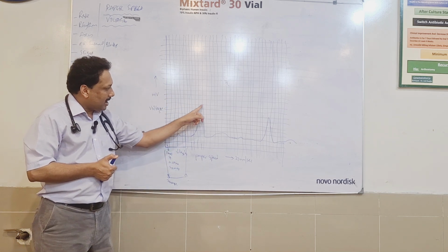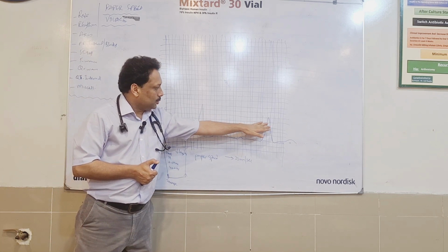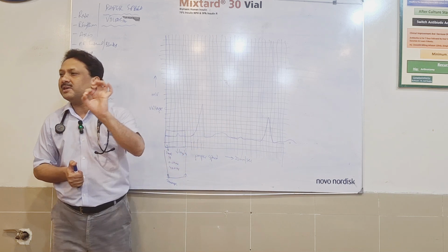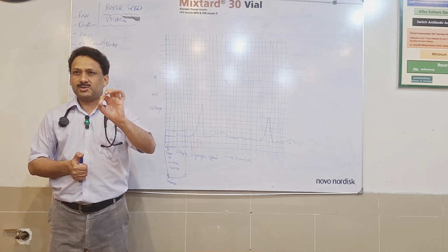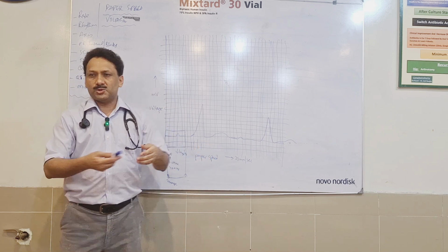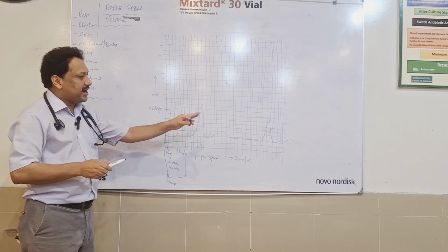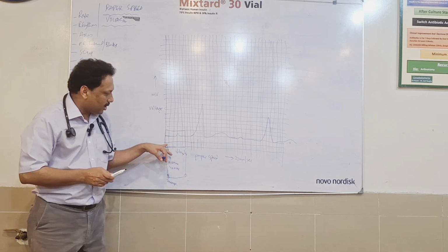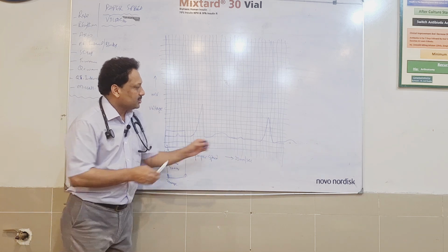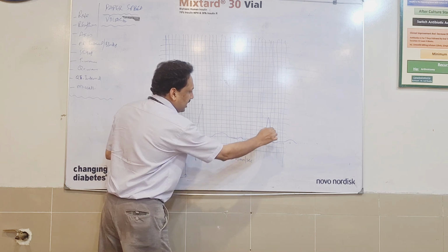I mean the difference between two RR intervals should be 0.8 seconds, because the cardiac cycle is 0.8 seconds. So if a person has an exactly normal heart rate, after every 0.8 seconds, and if I am talking about 0.8 seconds, how many boxes should there be? 1 large square, 2 large squares, 3 large squares, 4. So there should be 4 large squares: 1, 2, 3 and 4.